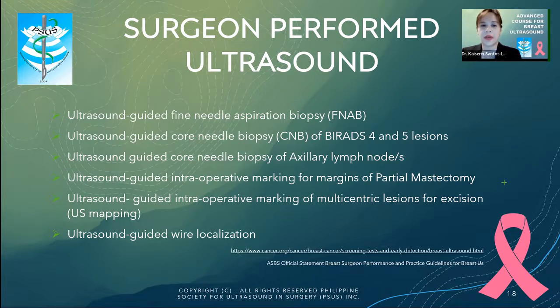They are fine needle aspiration biopsy for cysts, core needle biopsy for BIRADS 4 and 5 lesions, core needle biopsy for suspicious looking axillary lymph nodes, intraoperative marking for our gross margins during our partial mastectomy, intraoperative marking of multicentric lesions during excision.